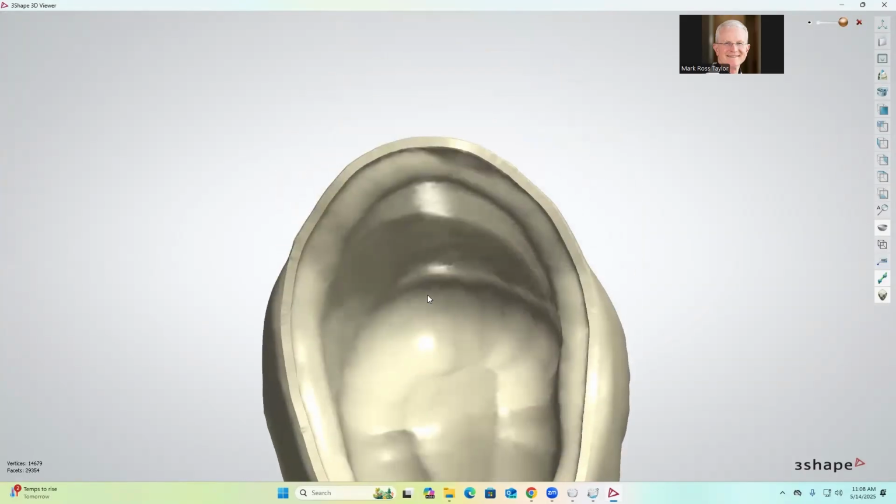Everybody gets wrapped around the weeds about this area right in here. This is the external portion of the margin. This point is for milling safety. If the margin goes to a knife edge, it has a very good chance of chipping that margin away. So even though it looks massive, this little protection is only maybe 2/10 of a millimeter. It's fractional. A rubber point will remove that, but don't panic about it.